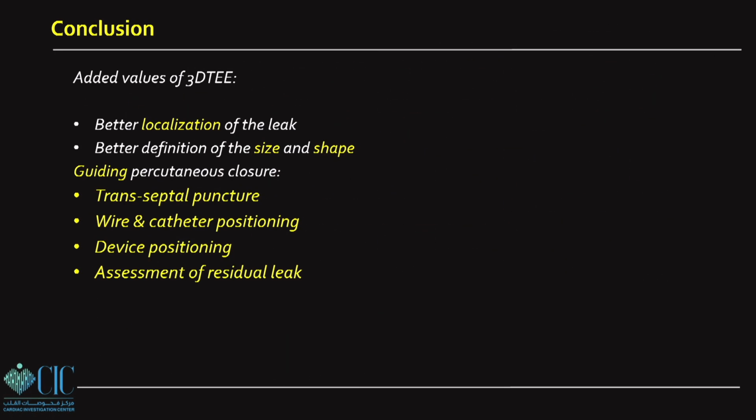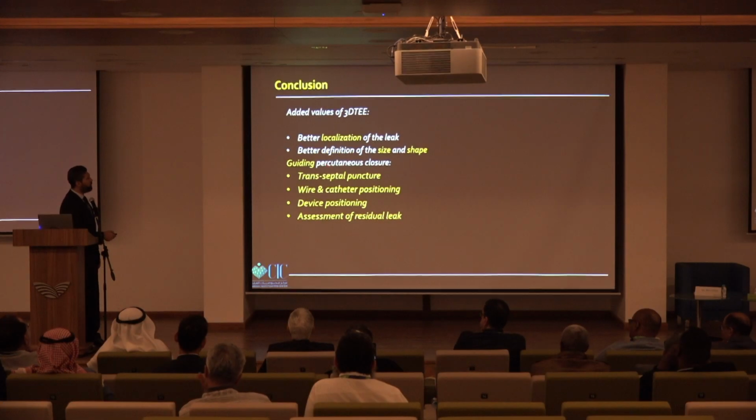So in conclusion, TEE isn't mandatory in paravalvular leaks, but 3D has a lot of added value in terms of localization, shape and size detection, and guidance of the procedure. Thank you so much.